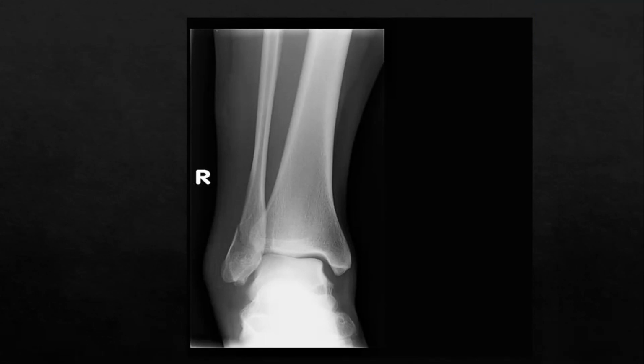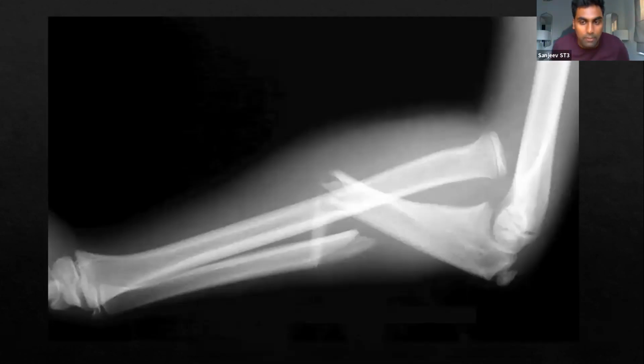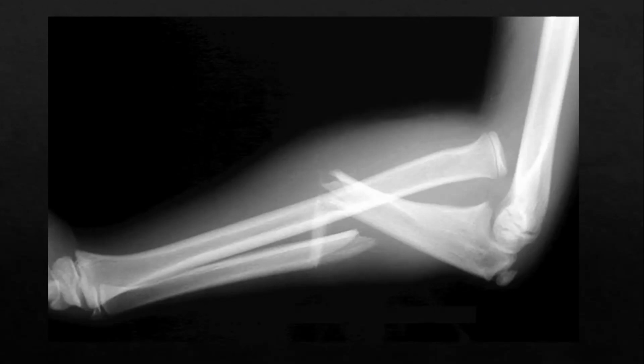No worries. All right, guys, so who wants to do the next one? I'll put it up first so you guys can have a look. It's a bit more complex, so this is where I want whoever is presenting this to really slow down and use that checklist that I mentioned before, because I think it will come in handy for this quite complex X-ray, okay? And please don't worry about getting this wrong, because I think this is probably one of the hardest ones on here in terms of description.